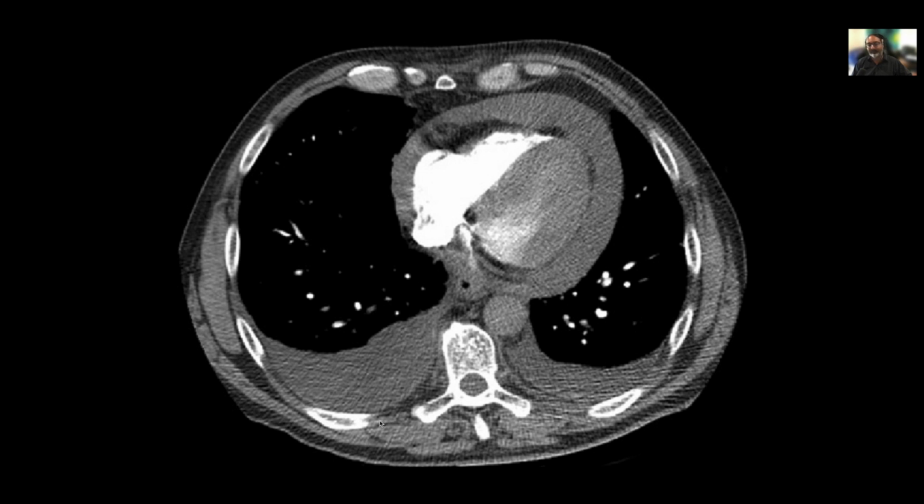Yes, pericardium. Pericardial effusion, absolutely. So you got that correct. It's fluid in the pericardium, between the wall. You can see this line here, and that looks like the myocardial wall from the outside. And so that is a pericardial effusion. It's fluid in the pericardium.